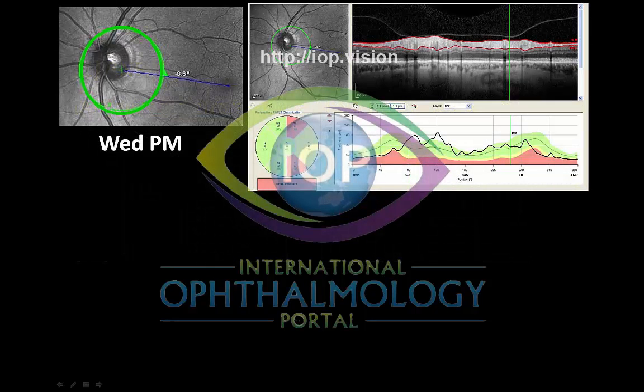So let's put this into clinical practice. These are two scans collected on consecutive days on one of my patients. So on Wednesday afternoon, you can see the scan, and quite clearly you can see that the peripapillary demarcation line is not centered on the disc. You can then see all the data that is produced, and all the data analysis is occurring on the basis of the demarcation line being in the wrong place.